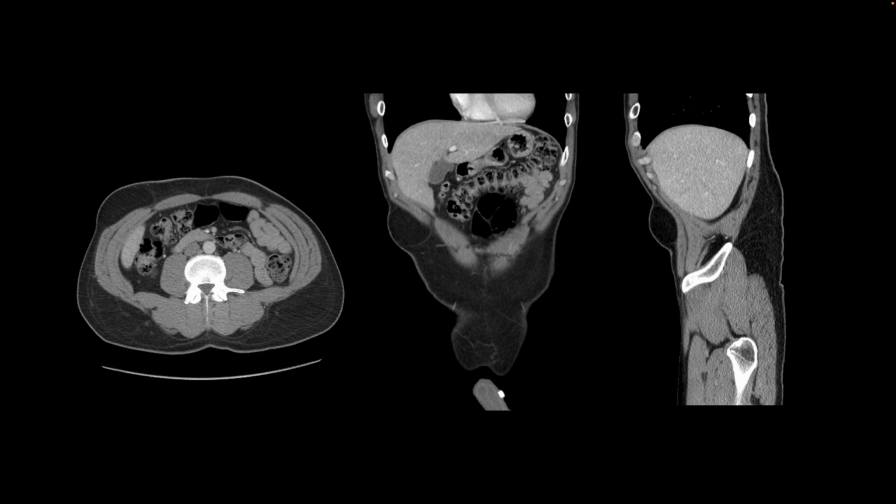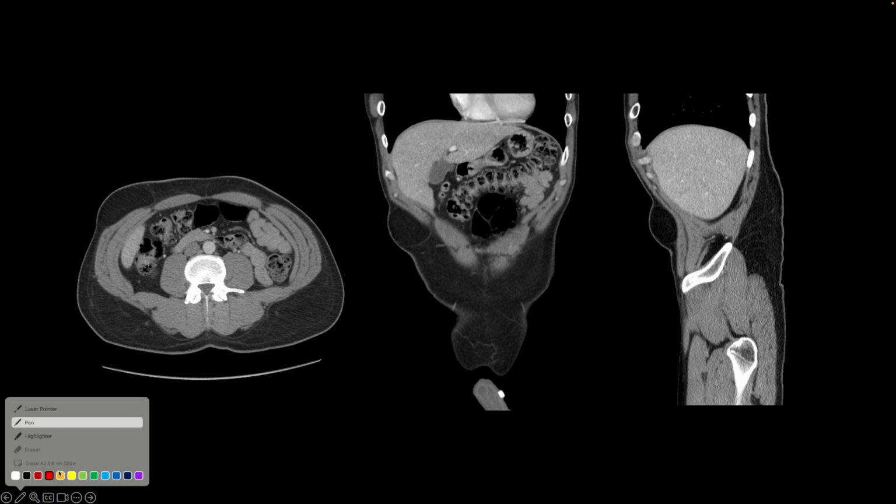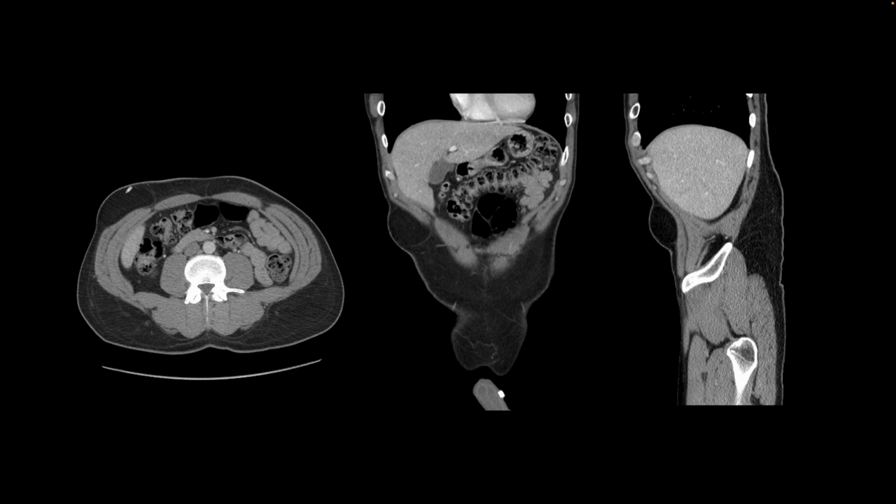This patient presented with a swelling, and sometimes that's the only indication, swelling or a mass. And what you want to remember from this case is that the finding may not be inside the abdomen, it may be in the abdominal wall. And so it makes it easier when I show you the corresponding three cross-sectional images. Here on the axial, we see encapsulated fat. Right here on the coronal and the sagittal, so this patient has an abdominal wall lipoma.